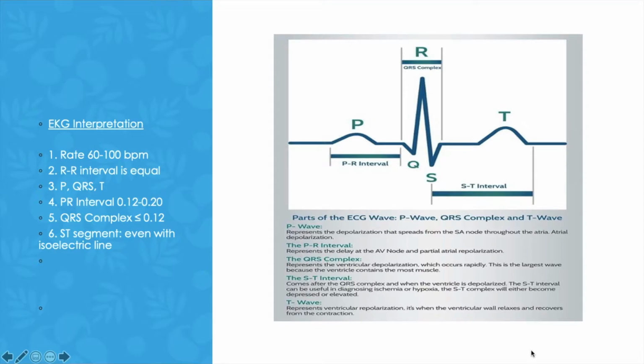So for the cardiac dysrhythmias, first off, I want to start off by telling you guys how important it is to understand what a regular cardiac rhythm looks like, a regular sinus rhythm. This is the way that you're going to understand when you're looking at an EKG if something is missing and what's off, okay? So in a regular cardiac rhythm, every beat is supposed to have a P, a QRS, and a T wave.